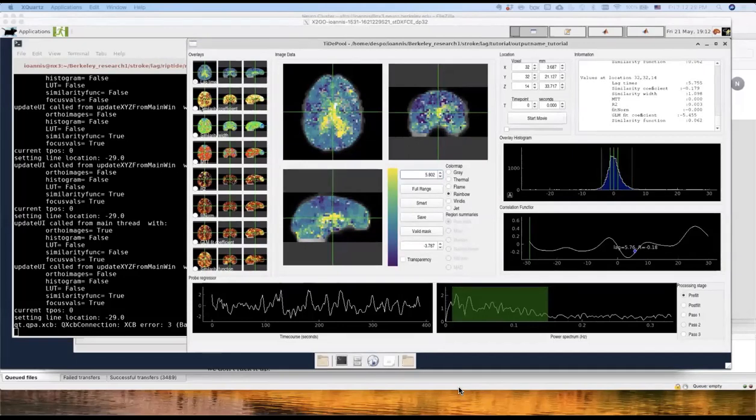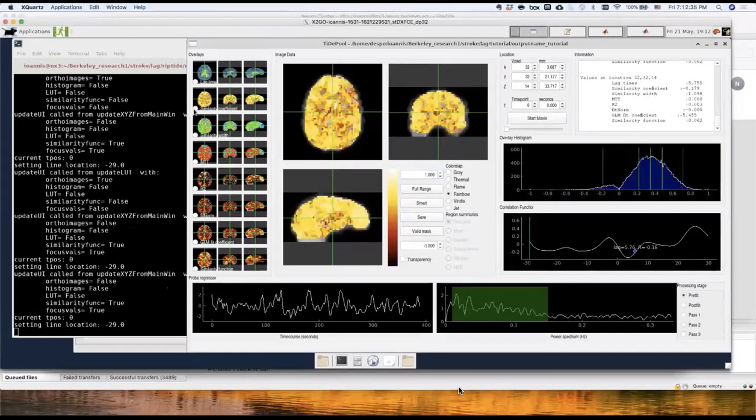And obviously, one might not be just interested in the lag times and can click on the different options. This is the correlation value. Again, this is the maximal correlation, the maximal correlation at that particular lag time with the probe regressor. As you can see, this is the distribution of the voxels.